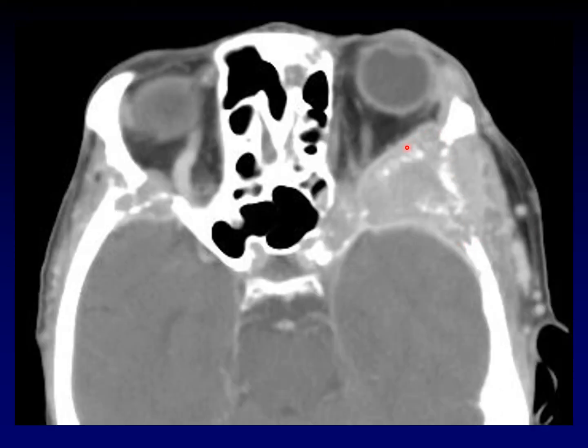Here's an example of a large mass that isn't actually arising in the soft tissue of the orbit. It's rather arising within the triangle of bone that sits behind the orbit that we call the sphenoid buttress. And like most masses that arise in the sphenoid buttress, this mass is extending into the soft tissue of the orbit, into the middle cranial fossa, and into the temporalis fossa. Intraosseous meningiomas that occur in this location can have a similar mode of spread, but this is very, very destructive, this mass, very aggressive. Furthermore, it has a friend on the other side that might clue you in to the diagnosis of metastatic disease.